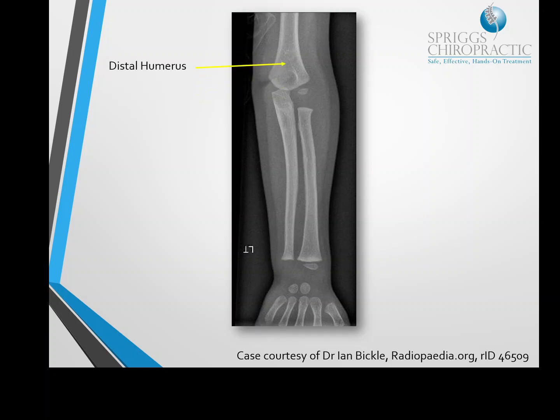So of course we've got the distal humerus. Oh my god. Well, that's clearly not the radius, that's the ulna. That's the radius on this side. I'm going to leave that in. That's just terrible animations by me just there. But I'm going to leave that in. I think that's great. We also have the carpals, as we went through last time in the last lecture series.